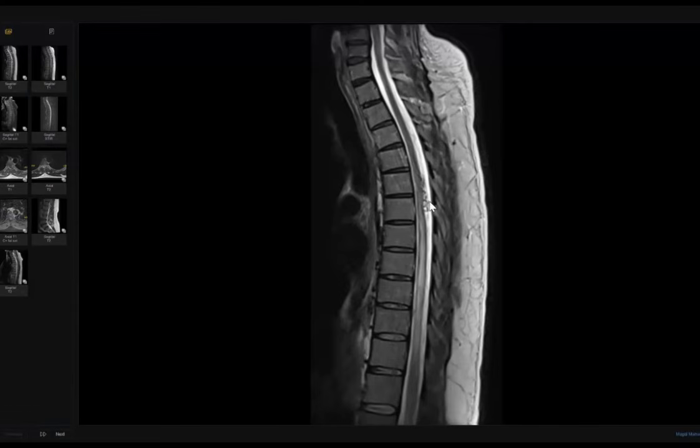Like I told you, there are two buzzwords. From the beginning, you should decide in your mind what the diagnosis is. What happened here? Swollen cord with abnormal signal plus multiple vascular channels. This means in your brain this is AVF. Then describe all the details, whatever you will describe. So from the beginning, keep yourself on the proper correct track.